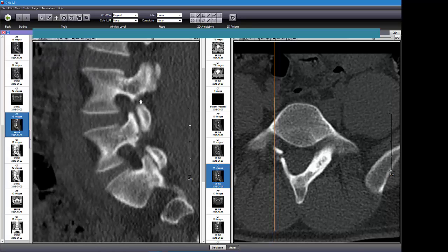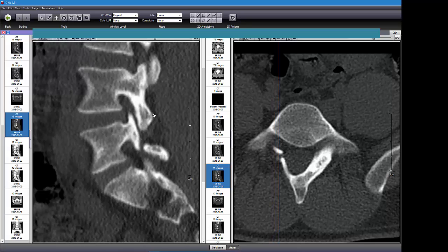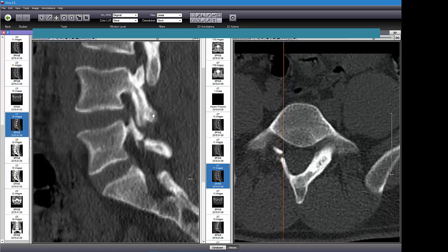And it's starting, that's not a fracture there, it's just we're getting out so far you're losing the articular process. We're just lateral to it. So that's not a fracture. That's where this can get a little confusing sometimes. But you can clearly see where the cut line is confirming it's going right through there. And on this free version, sometimes these lines are off a little bit.